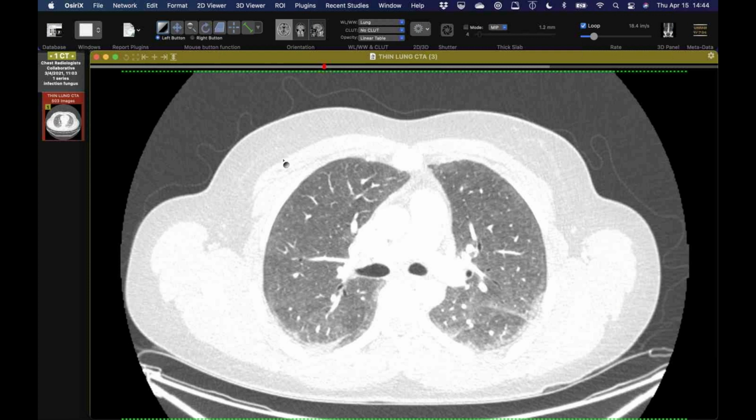There's something wrong with that tissue that it just doesn't want to behave itself. And why they get a bicuspid valve, I don't know, but that's present in about half of them. It's like a hypertrophied LV too. Yeah, it is definitely hypertrophied, which would go along with that valve. So hopefully he'll get follow-up now, but they're going to leave that alone.